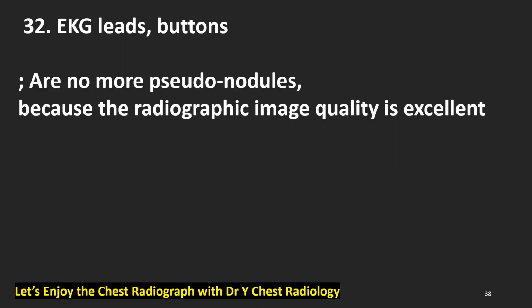Next has no radiographs, because I think EKG leads and shirt buttons are no longer pseudo nodules, because the radiographic image quality of today is so excellent. It is not considered a pseudo nodule, just not a nodule, nothing.